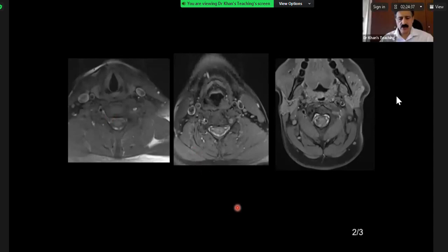Okay, I will take over. Actually, the abnormality is on the left. The right is absolutely normal. This is the filling defect. If you can see on this T1 weighted sequence, some high signal here, and it goes into the foramen, and it is completely obliterated. So completely occluded, there is complete occlusion. Means that this was a dissection, but with complete occlusion.